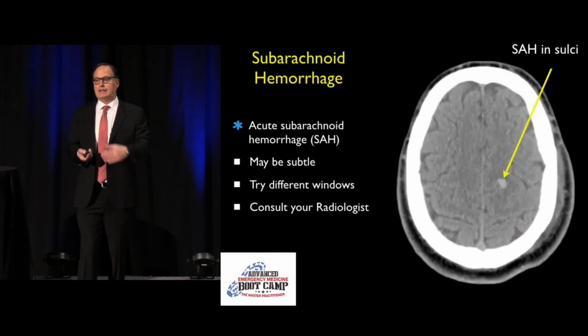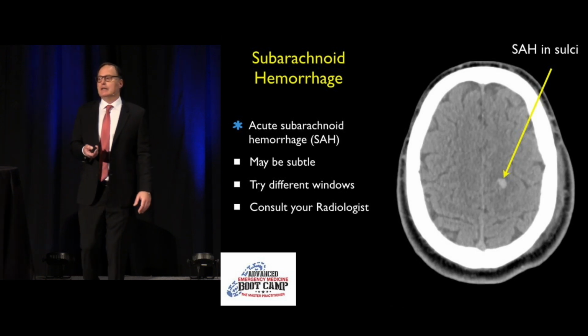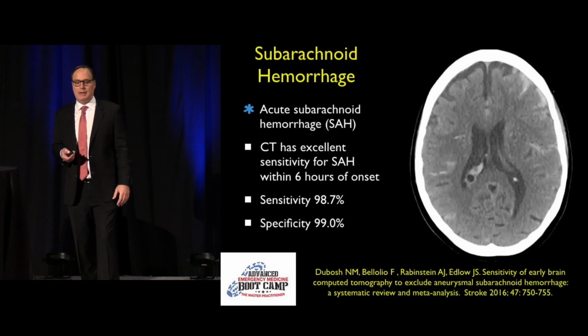Here you can see, again, this is a very small subarachnoid, could be subtle, difficult to see. This would be a good chance to call your radiologist to have them help out.